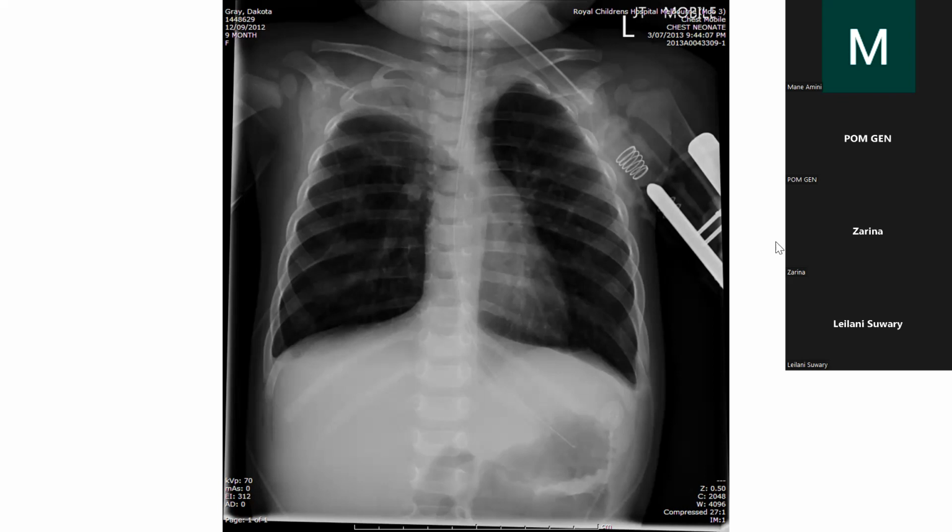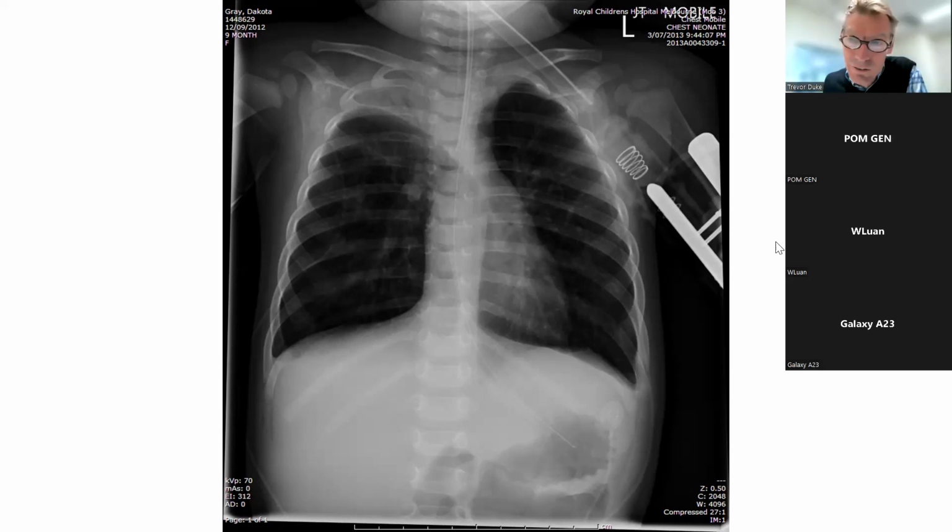Congenital heart disease. Pulmonary embolism. Oh, okay. Yes, if you get a pulmonary embolism, sort of. Usually you don't see that much. What's the classic condition that gives you reduced blood flow to the lungs, though, in black lungs?